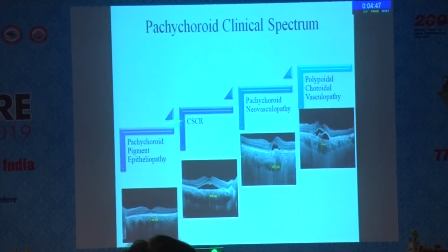And again, in pachychoroid, the choroid has a really important role. Our understanding and even the definitions keep changing, but the understanding is that the outer layer vessels are quite big, and they are compressing the inner, smaller vessel layer. So it's a kind of spectrum. Previously, we thought these subtle RPE changes were probably healing CSR cases, but probably not.